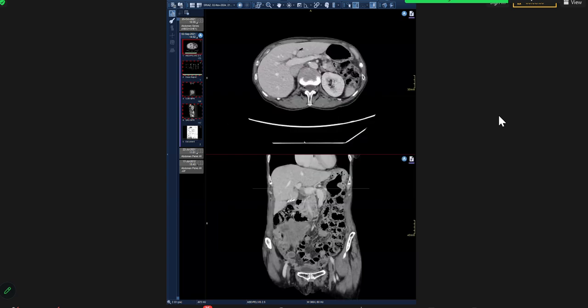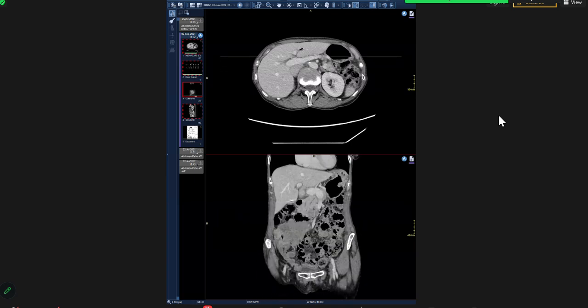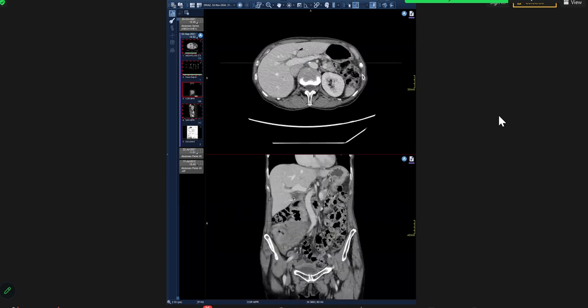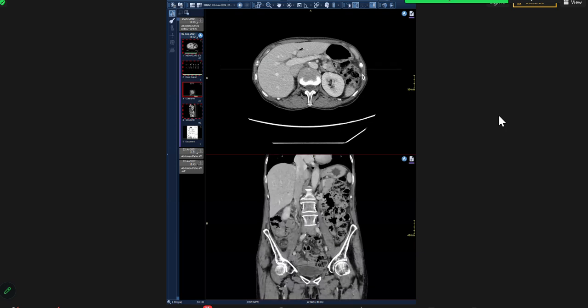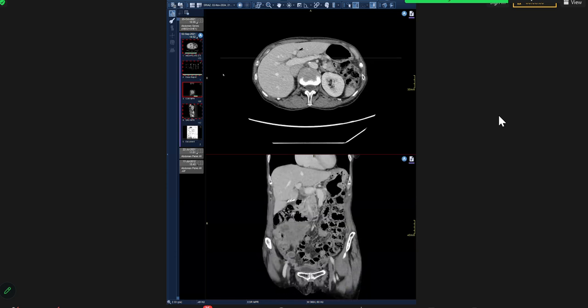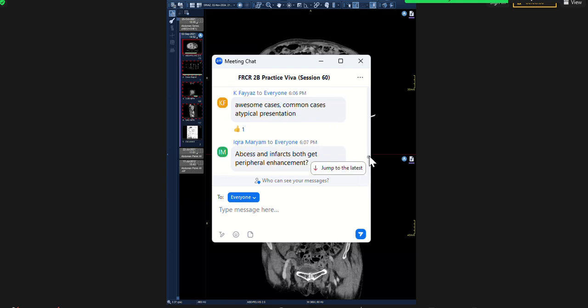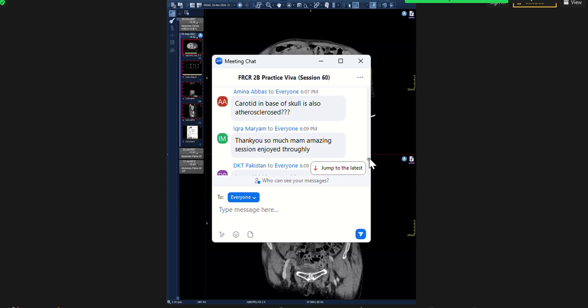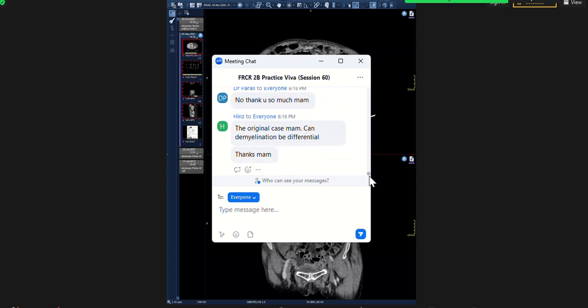And I don't appreciate any upstream dilatation due to this mass. In the coronal images, I can appreciate that this mass is likely originating from the cecum, but I would like to look for the ileocecal junction. I think this mass is originating from the cecum and probably the terminal ileum with a large exophytic component, which shows almost homogeneous enhancement with no significant internal necrosis, and it is not causing any upstream dilatation.